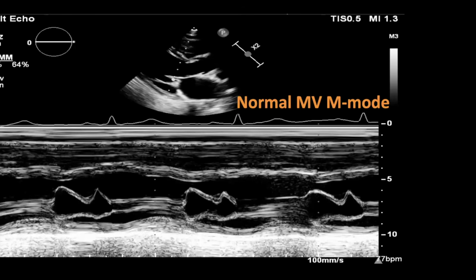So what do we have in the M-mode here? Anyone knows the names of the signals here? I'm used to this silent response, so I will take it from here. So this is diastole. Let me try to show the pen. From here, it's the beginning of diastole, where the mitral valve opens. So what will we call this one? D, diastole. And then we will have our early filling, or passive filling, they will call it.